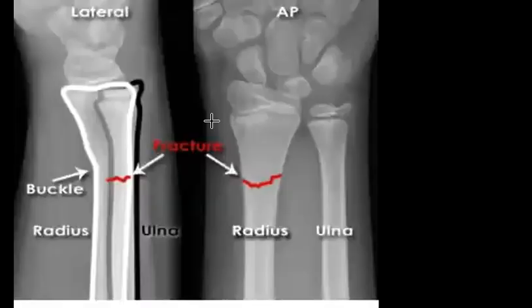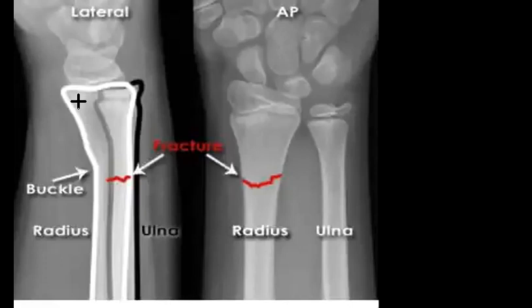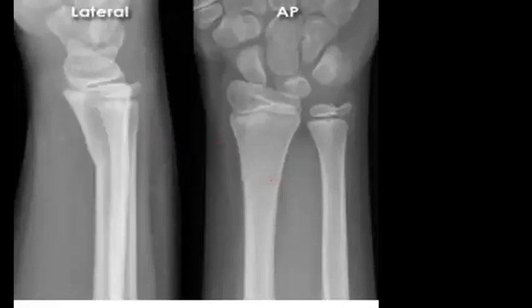And you remember when I showed you the fractures of the pediatric age group, and sometimes it's just buckling, as in this case. So you can see some buckled cortex or mild buckling of the cortex. And you can see also the fractures sometimes. So this is what is called the greenstick fracture. Okay. And sometimes they like to show you what is called a torus fracture.